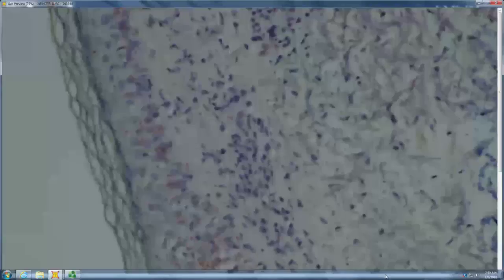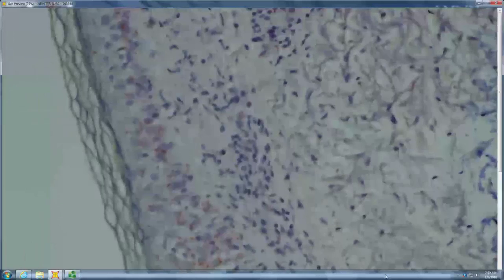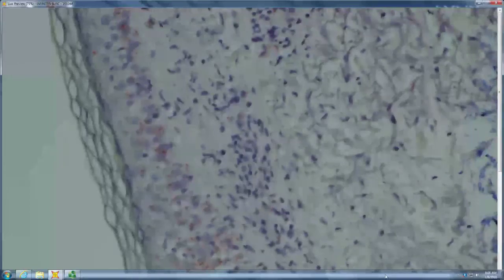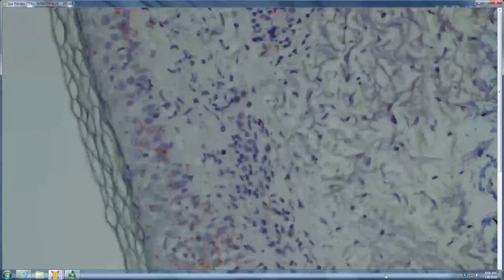Okay, and then there's another one that happens to be an immunostain, just so you can see what spirochetes look like. So they tend to be in the lower third, and they tend to be vertically oriented. So lower third of the epidermis, vertically oriented. Of course, that's exactly where melanocyte dendrites are, right? So with an immunostain, easy to tell them apart. With a silver stain, the difference again is melanocyte dendrites are black and granular. Spirochetes are gray and not granular.